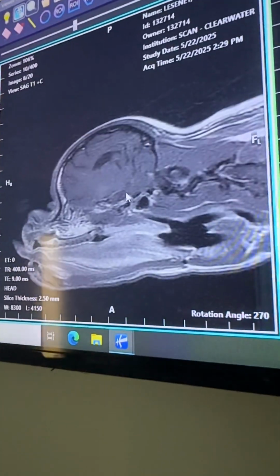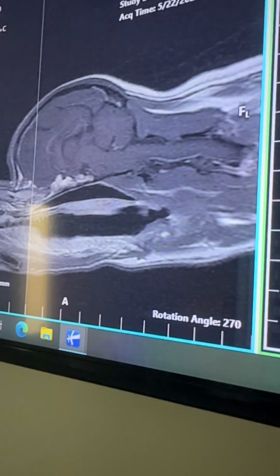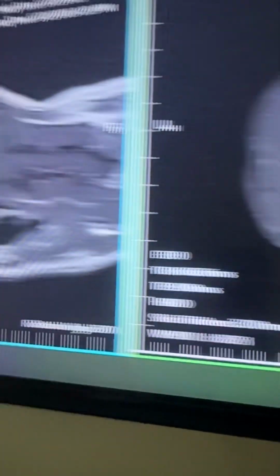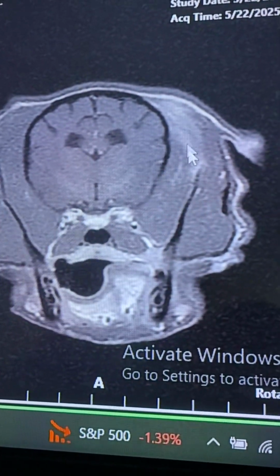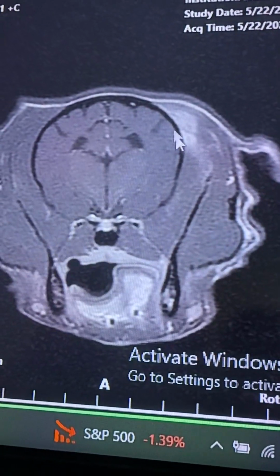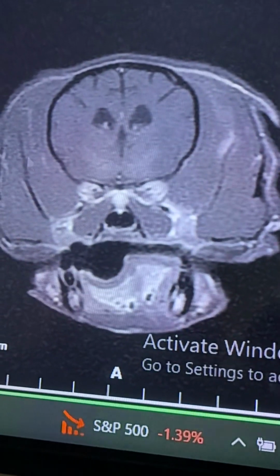I'm going to show you the muscle situation too. So here's her post-contrast side view image. What I wanted to see is, did those bright spots in the brain light up after contrast? So if we look here and on at the brain here, this again was there before. Start seeing a little brightness here, and then see that? You see how this area takes up contrast in comparison to this area. So I'm like, did you hit your head, or is this an area of inflammation in the muscle? You see, that's interesting as well. If we go back to where those bright spots were, this looks exactly the same as before.